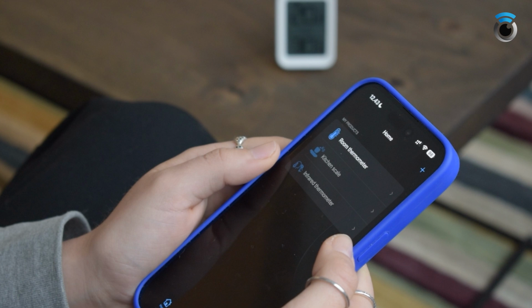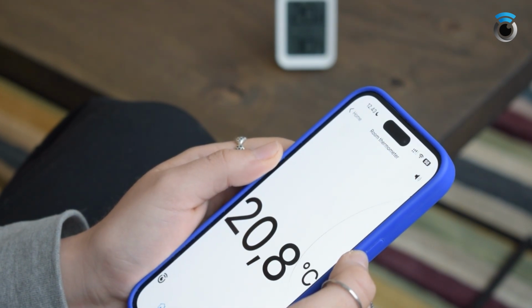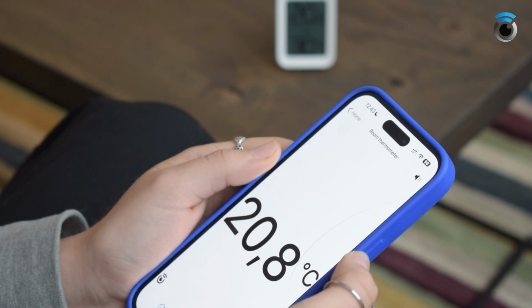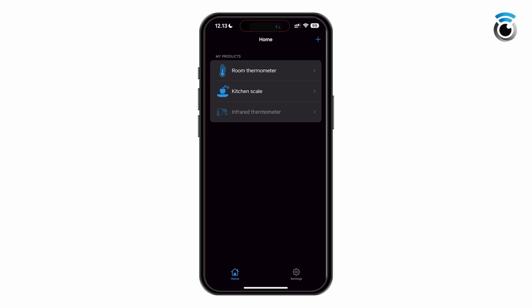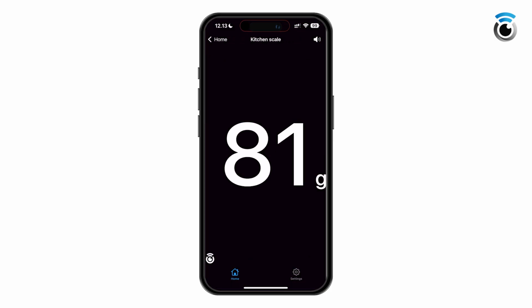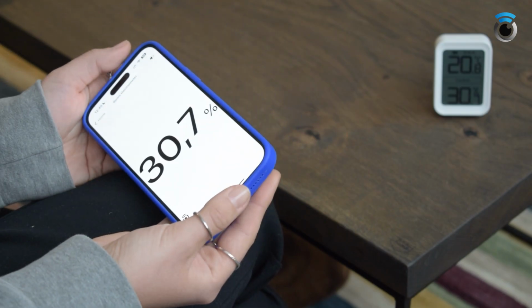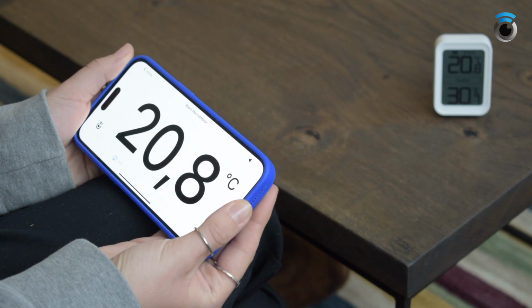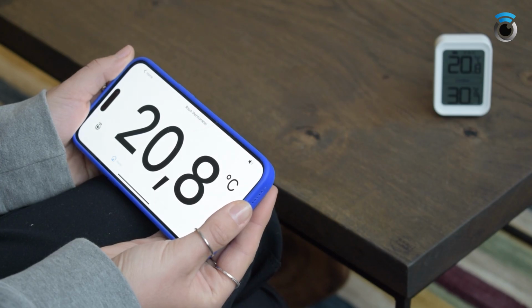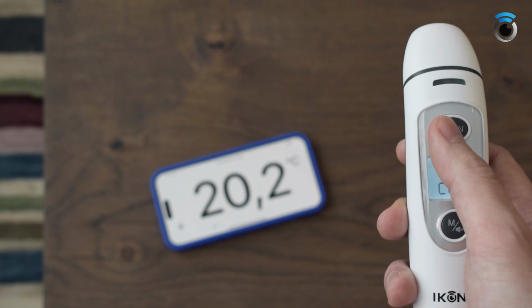To use a product, simply tap its name on the product list and ensure it is turned on. The measurements are displayed in large format in the middle of the screen. Turning your device on its side gives an even larger display of values. Updated values are read out automatically when a reading device changes.